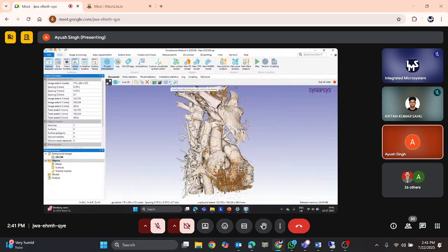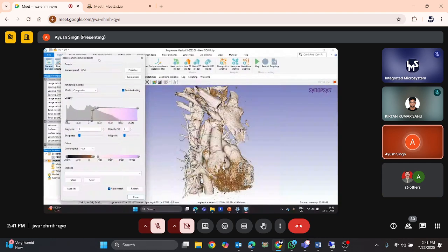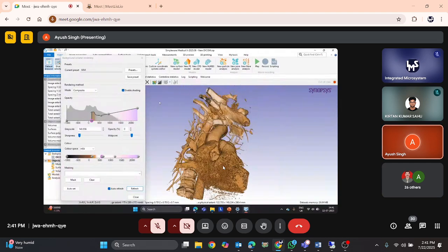Why so? Because we have certain background volume rendering settings that we can use for easier visualization. We can either manipulate them manually, or we can automate this process. How? We can increase or decrease the dimension. We can manipulate the HU value and the color value that we require, so we can also manipulate the color coding.